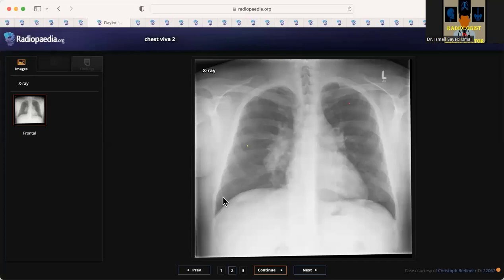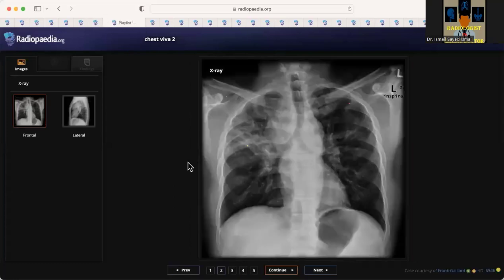Yes. So it definitely needs a histopathology diagnosis, because it's called the great mimicker. So a lot of things look like sarcoid, so they need a tissue diagnosis. But yeah, that's well done. You've mentioned your differentials. You said it could be infection, TB, but it's unilateral. That's how they manage. So well done. Yeah.